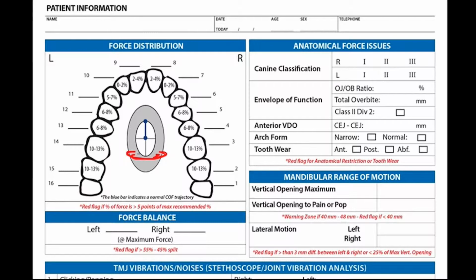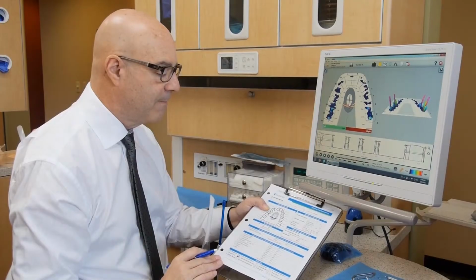So we can refer this patient's kite tails, which are way posterior and definitely outside the target and way too long, and compare that with what would be normal, and it's easy for us to see that these are definitely red flags for this patient.